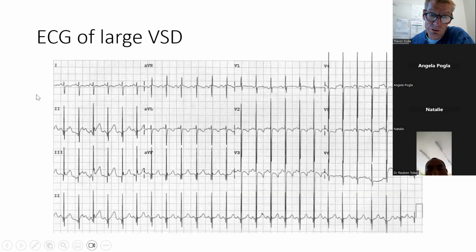Yes, the P wave morphology. When you're looking at the P wave morphology, you need to look to see whether the P wave is less than 2 small squares in duration and less than 2 small squares in height. You can see that all the P waves are around 1 to 2 millimeters in length and probably 1 millimeter in height. So there's no evidence of left or right atrial hypertrophy.